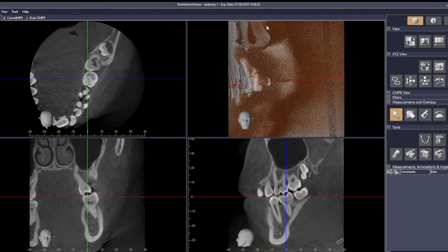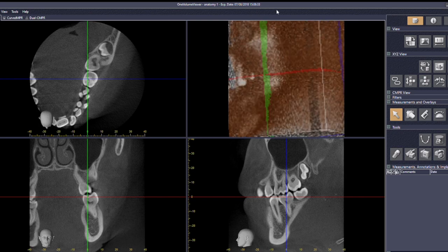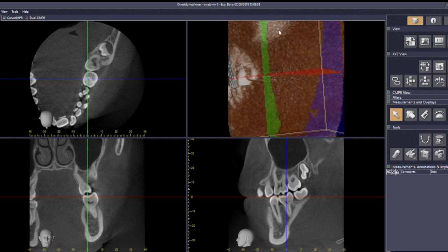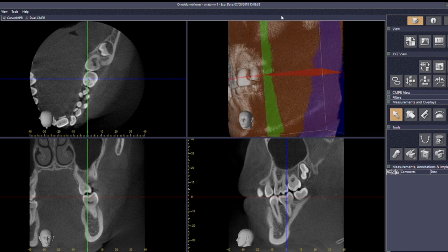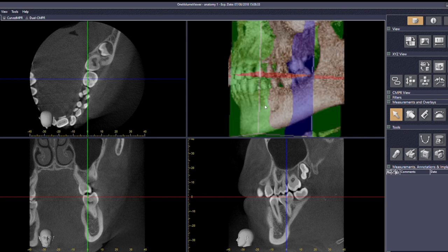That's their septum, and this is the alar. Obviously, the front of the nose has been chopped off by the scan, which is why it looks this way. It looks a bit unusual, but there, that's the lip commissure there. And I've done that by right clicking and holding and dragging down. So I'm going to right click and hold and drag up, take the soft tissue off and go back to the teeth. That looks pretty good to me.